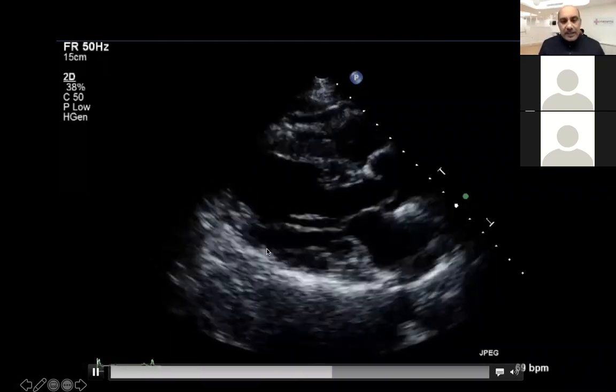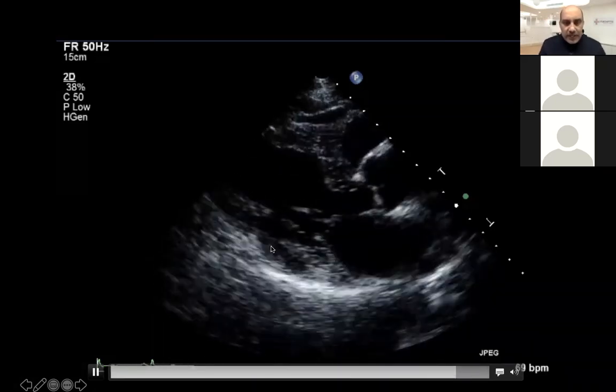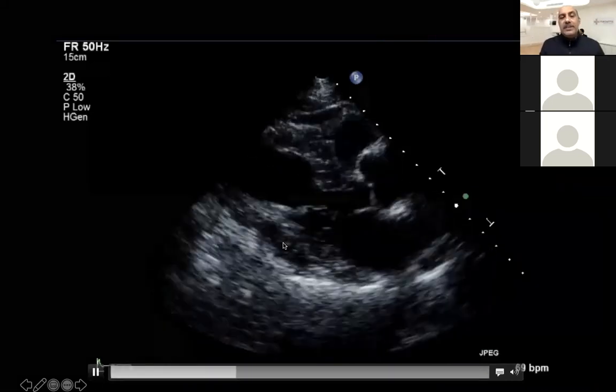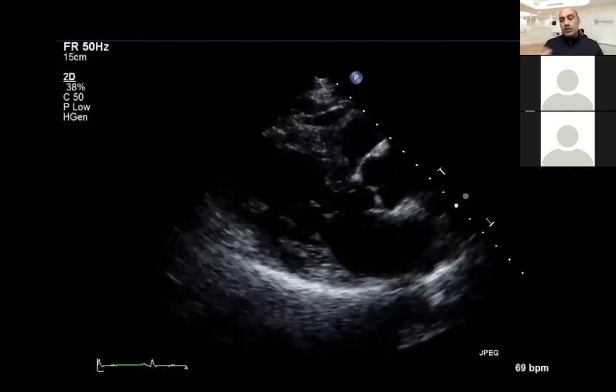So what artery territory possibly is going to involve? I can say LAD is fine, but I would say that probably the person has sustained a circumflex territory infarct. I cannot predict on the single view whether it is proximal or distal.